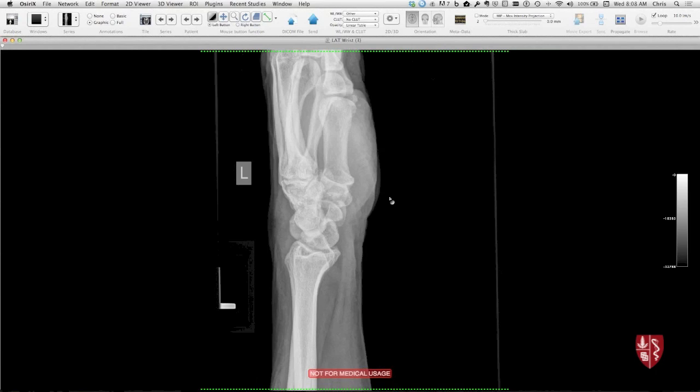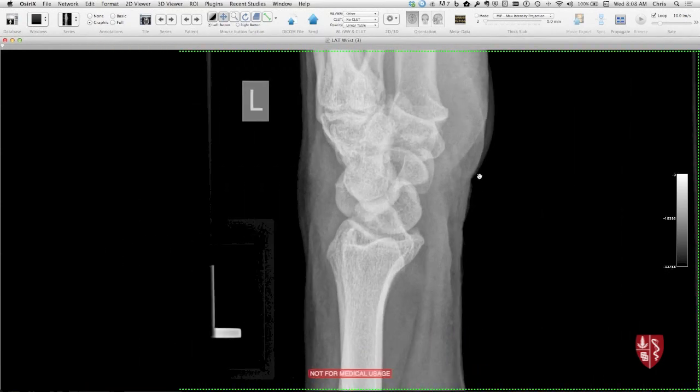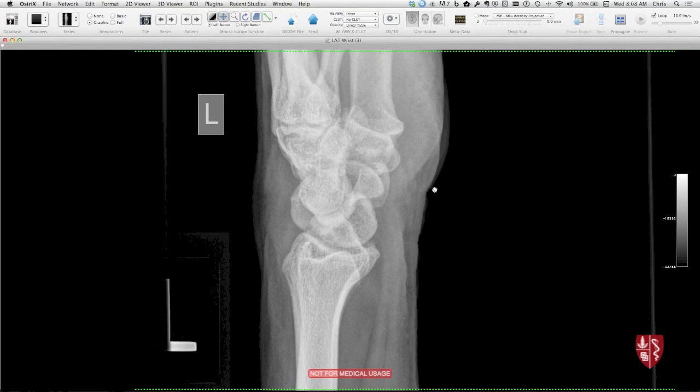And if we look at the lateral here, can people see now, after those diagrams, that this is one of those DISI malalignment patterns? I see mostly nodding yes. So, distal radius and ulna, pretty good lateral view. Here's the radial styloid process coming through there, just to ensure that it's a pretty normal lateral. Here's the lunate, and it's tipped posteriorly, so that's dorsal tilt of the lunate. The scaphoid, the trickiest thing I think, is that the pisiform can overlap here. So this is pisiform, but the scaphoid's like in here.